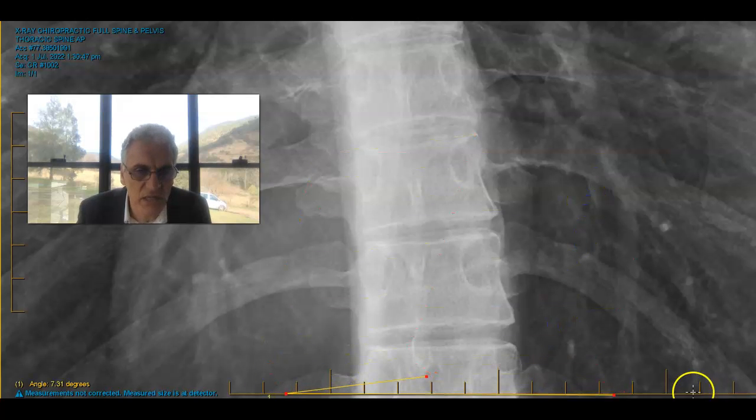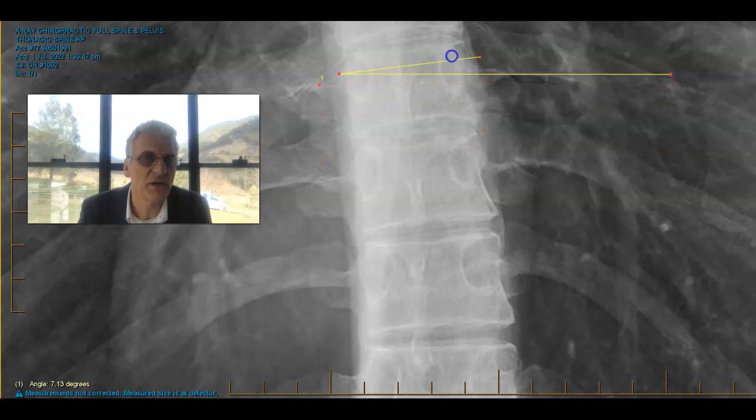So if you've used IntelliViewer before, you want to make sure that your horizontal is horizontal. And now we want to compare. Well, that vertebra is less angulated. That one is the one that we've measured. And both of these vertebrae will do. So let's leave it at that.